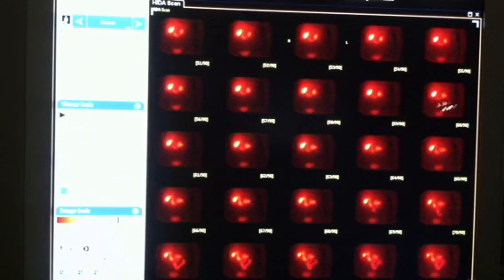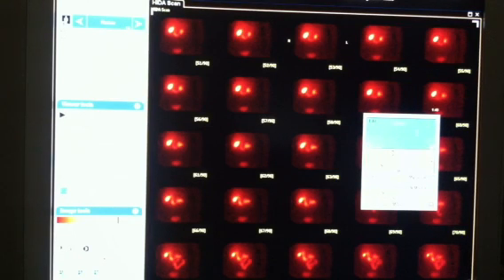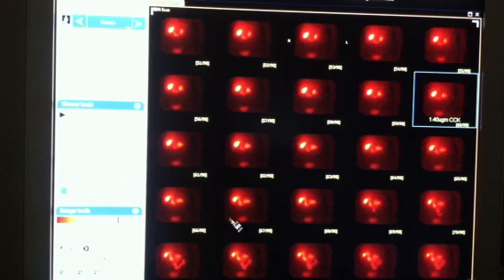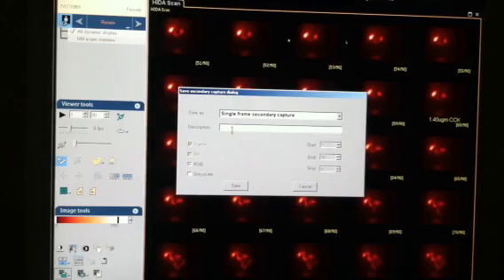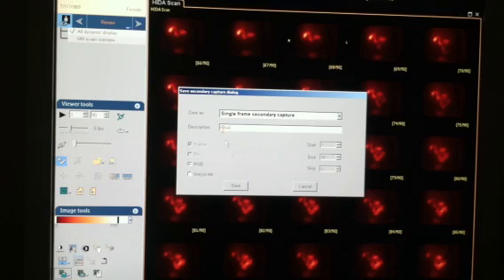Boom. Now, here's where we start our CCK. So what we're going to do is we're just going to take that box and we're going to put the amount that we put. And I always bring it up a little bit, make it like a 12. So that way it pops a little bit. Alright, now we're going to save this page and call it Hida 3. Go to the next page, last page here, and call this one Hida 4. And save.